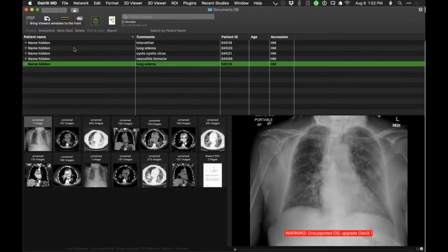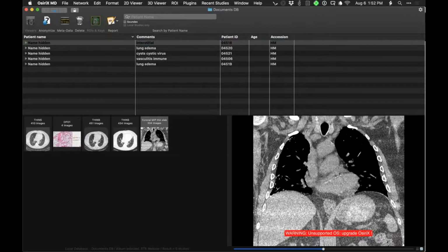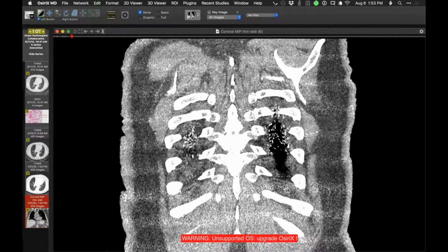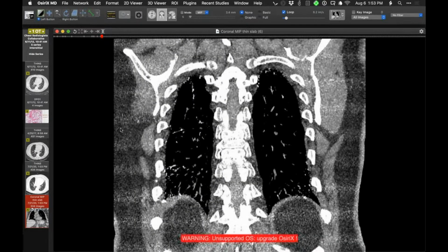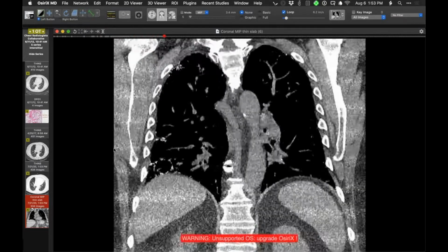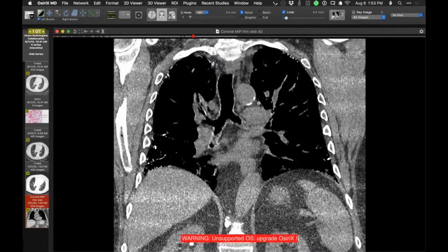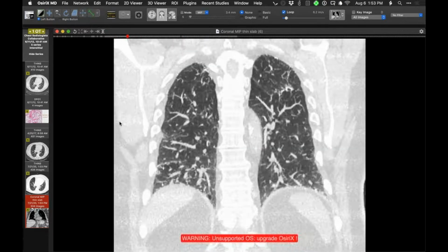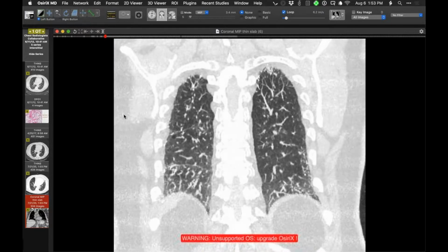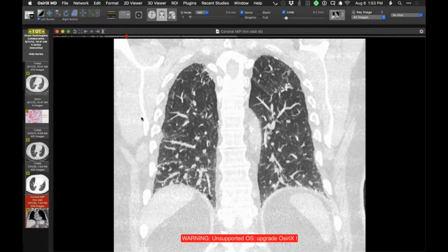So that was differentiation syndrome. This next one is something we've seen a bunch, but I'm going to show it to you because this is the first time, at least here, where I have pathology to show you. So this image is really nice because it's a super nice example of dendriform ossification. So this is a MIP slab, and I'll just make that bigger and give you a feel for the locations and the amount of abnormality. The lungs in between these look just fine.